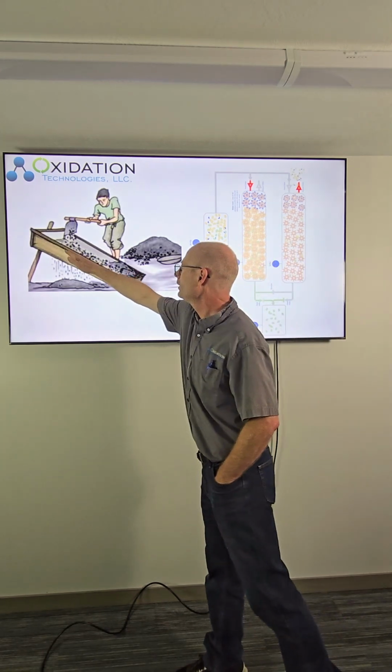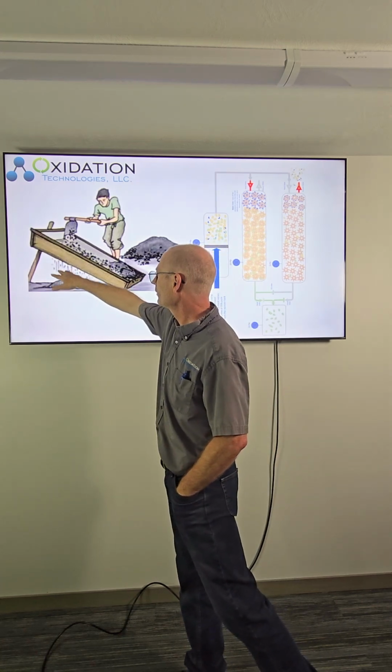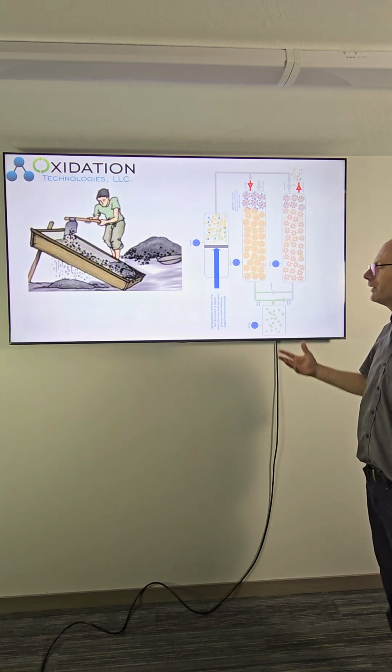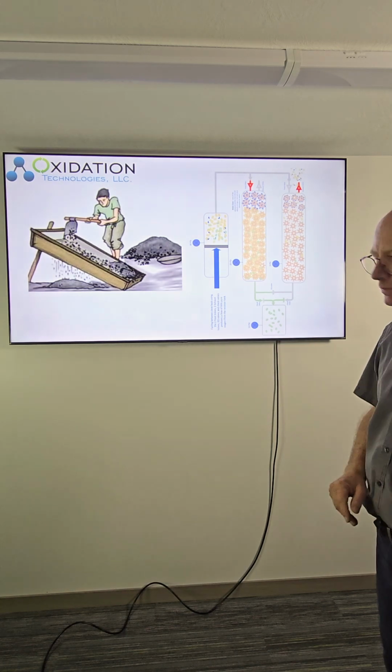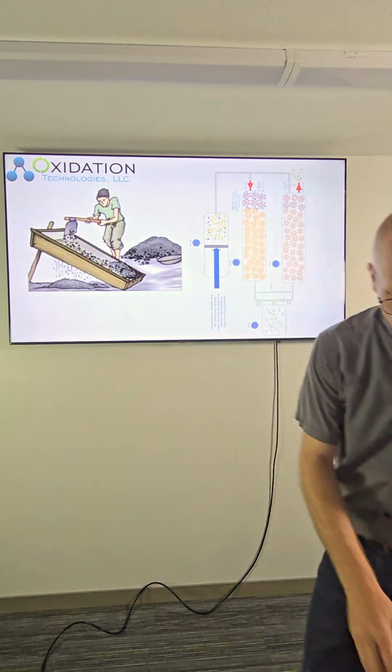Sieve beds here, and the oxygen falling through the bottom, the smallest parts. This would represent the oxygen. So it's a very effective method for removing the nitrogen and allowing you to be left with just nearly pure oxygen.